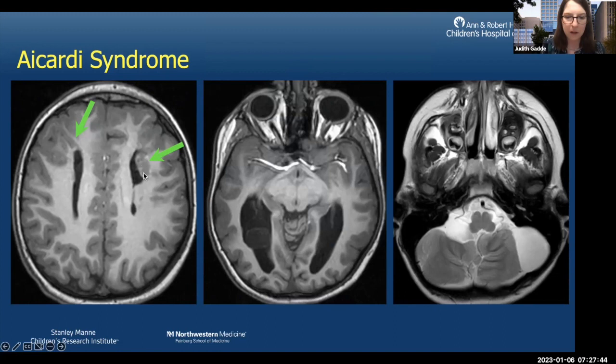And also here, even though this is a T1, we can see a cyst in the right lateral ventricle. That's not a common location for any other type of cyst, like you think about choroid plexus cyst. So this fits with the intracranial cyst indication.